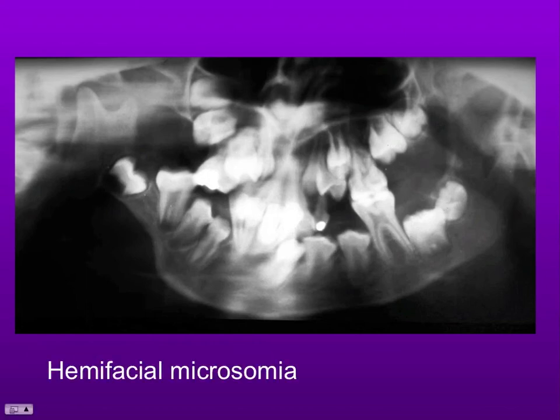This is a patient with hemifacial microsomia. This is not an inherited condition, but it is a congenital one, and it's caused by a vascular abnormality in the first and or second branchial arches during embryonic development. You should read up about this condition to understand it a little bit better, but the clinical consequences are gross facial asymmetry, often deafness on the affected side, so there are ear abnormalities as well, and obviously orthodontic problems for the future.